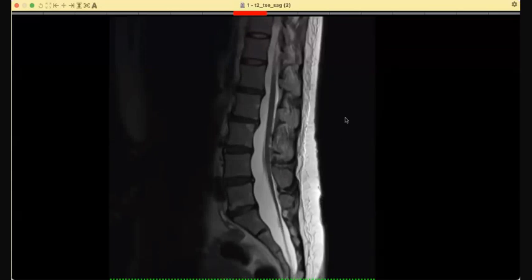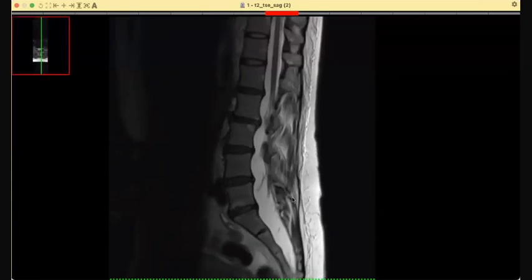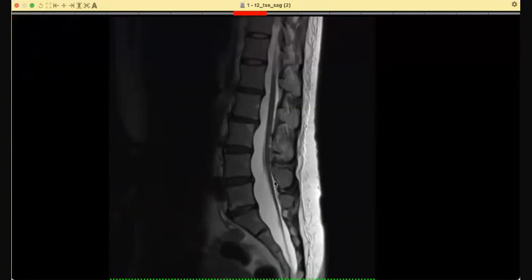here, so the feedback on the case is that if you see here, there is posterior scalloping, and then you can see this cord tethering. Where is the conus? You struggle to see, this is L5, this is L4. Where is the conus? You ask yourself, and it appears somewhere here, definitely L4 or L5. So that means that there is cord tethering. And then the cause of the cord tethering.